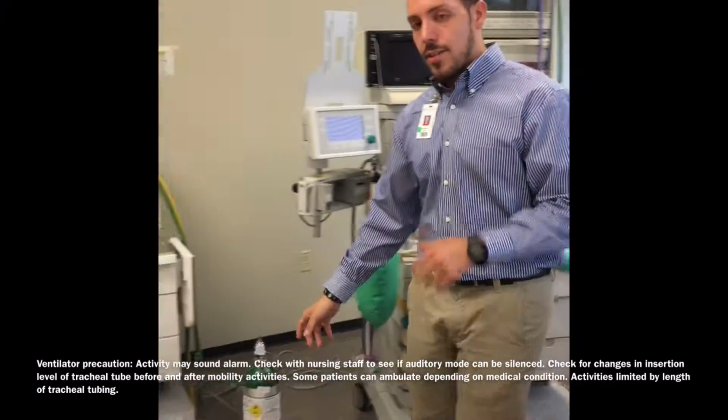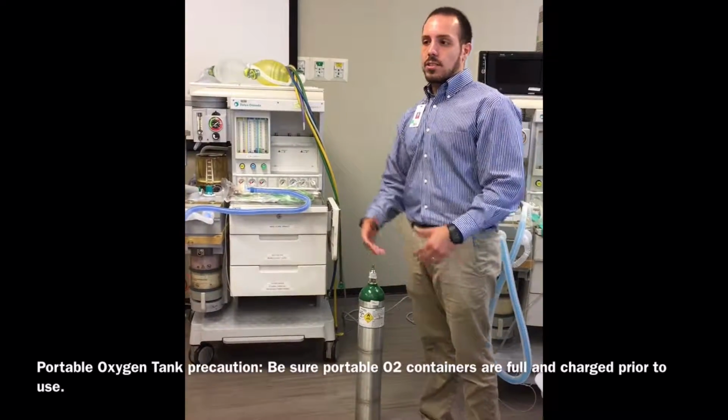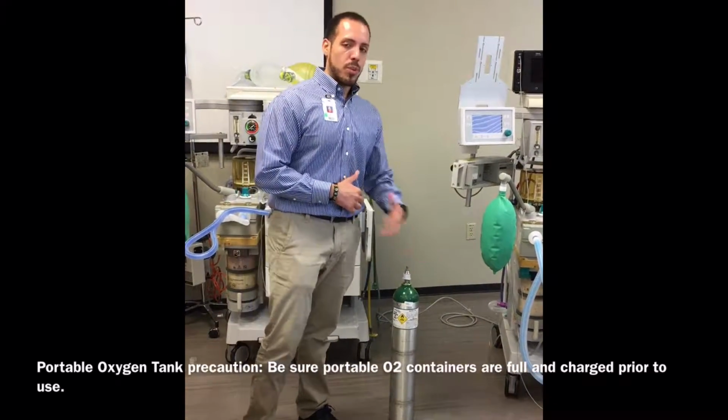The other device I have here is a portable oxygen tank. So this is not in a carrier, but obviously, when they're on a nasal cannula or things like that, and you are able to ambulate them, you would be using a portable air oxygen tank.